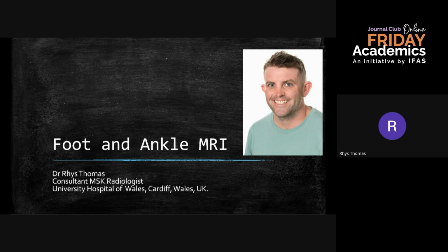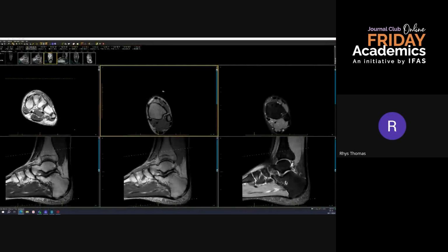So I'm going to be going through cases with you this evening, live from PACS. From my experience in different countries, different cultures have different attitudes to whether they review scans or just read the reports. I'm not quite sure what the culture is in India, so I hope I've pitched this at the right level for you. Starting with the first patient, this is a young patient who's presented with possible ankle impingement.